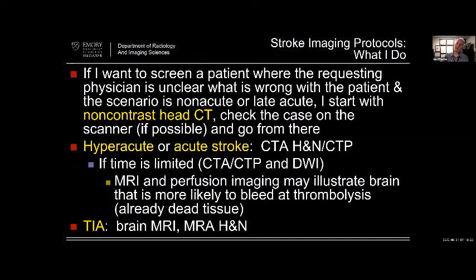Can you see an infarct at that time? Can you already see it? Is thrombolysis contraindicated? The usual things. And then pivot and say, okay, we're going to look at the arteries, and then, if possible, look at the parenchyma. And at the end of this, I'll show you, I've included one of the classic references, Howard Rowley's 4Ps. It's a classic reference. If you notice, it fits into the pipes, the penumbra, the parenchyma, that kind of thing as we go through it.